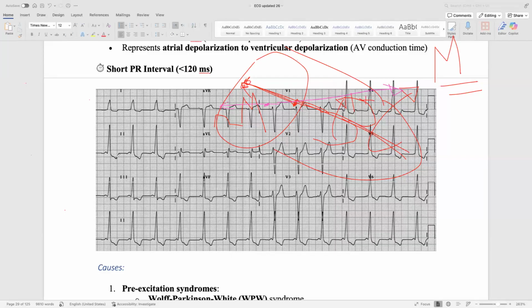On the right. The electricity changes its direction. The axis is going this way.